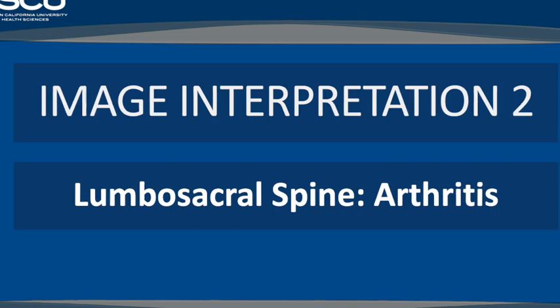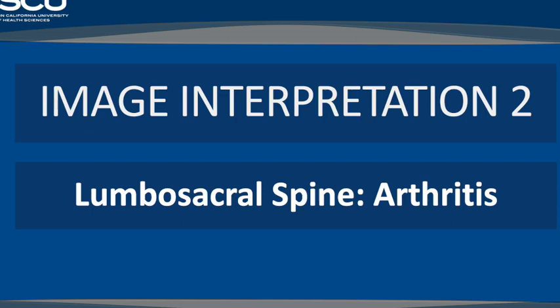This slide depicts degenerative joint disease affecting the sacroiliac joint. The image demonstrates the radiographic features associated with this condition, including joint space narrowing, subchondral sclerosis, and the potential presence of osteophytes. Transitioning to our next case, we have a 58-year-old male presenting with recent low back discomfort.